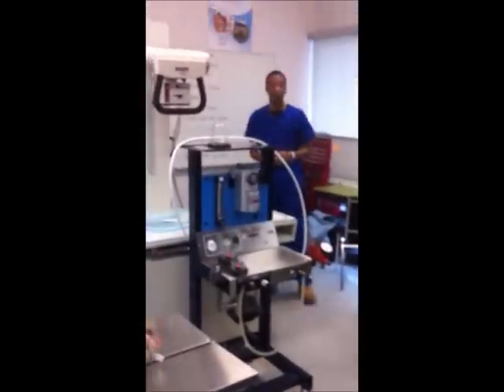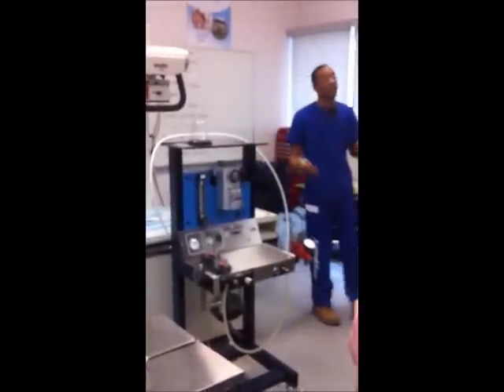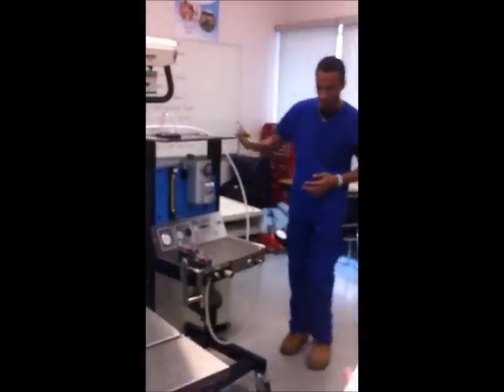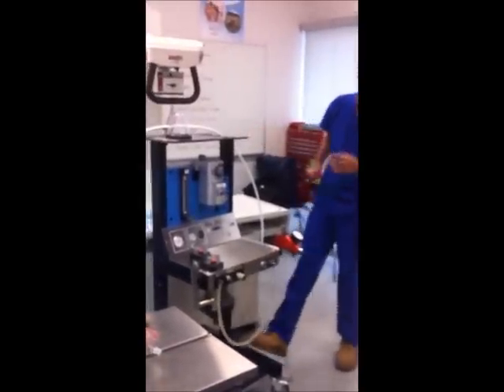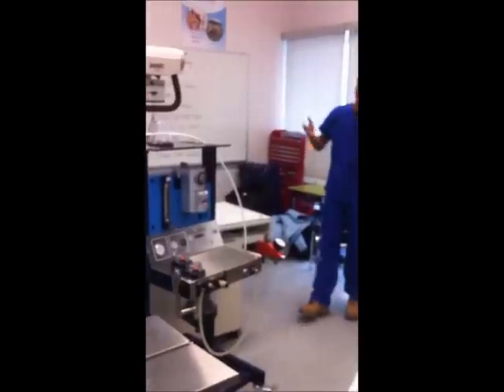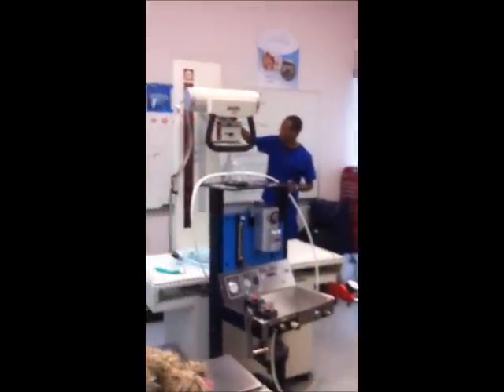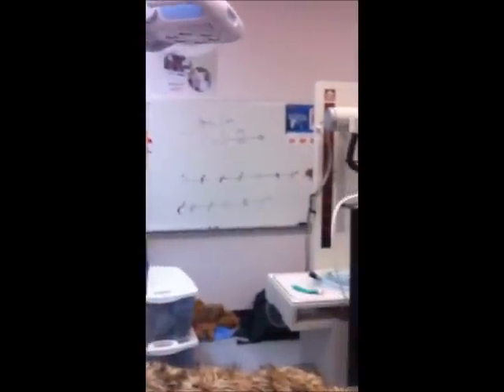We're basically going to be starting up with you guys. We're going to be asking you guys for the flow of the anesthetic machine. Okay, so these are all the parts of the anesthetic machine. We have the basic flow, your flow for your rebreathing system and your non-rebreathing system.